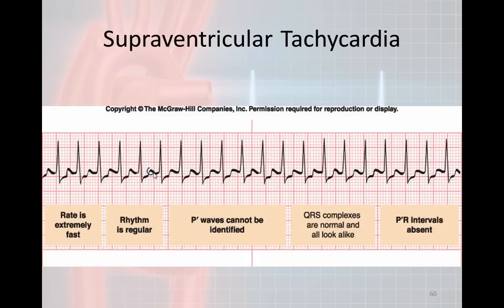Are these P waves? Are these part of the T waves? Are there P waves buried in here? I don't know. So if the patient were unstable, I would definitely start treating the patient immediately. If the patient were stable and we had a little bit of time, I would do a 12 lead on this person. I have done 12 leads on people who have been stable with a heart rate of 180 or 190, and I've seen that this is not actually SVT. It's actually been a specific AV nodal reentry phenomenon that I know how to terminate. Or I've identified this as a rapid flutter or a rapid fib. Giving this person adenosine would be like shooting a BB gun at a freight train. It's not going to change anything.